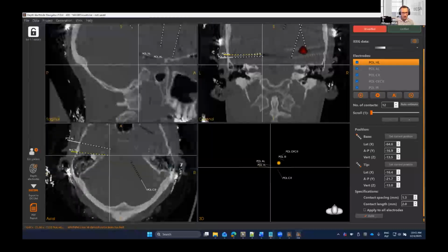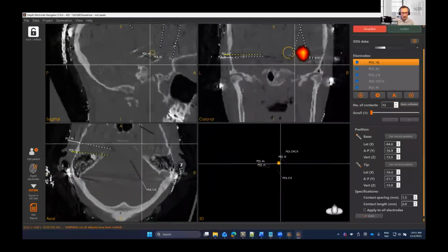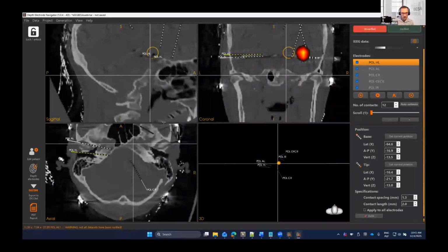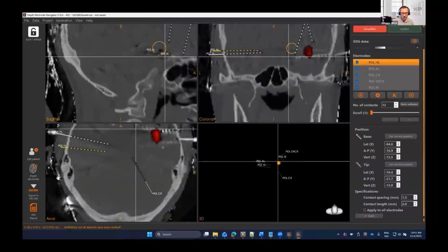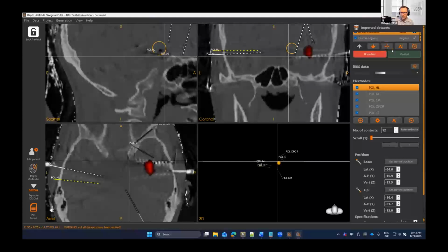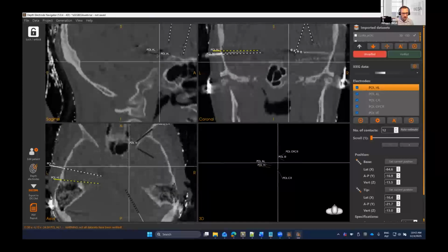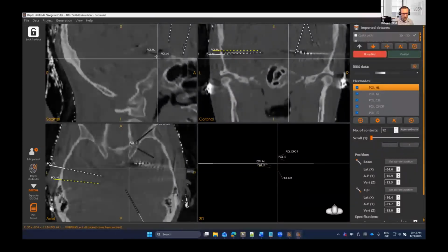And now the most difficult part is the right-hand side, because here we have a lot of electrodes, which is a bit tricky to find. But with my approach, going from the most bottom to top should not be so difficult. For the moment I will just disable the custom regions and Clara, so they will not shadow our electrodes. So we go to the most bottom electrode.